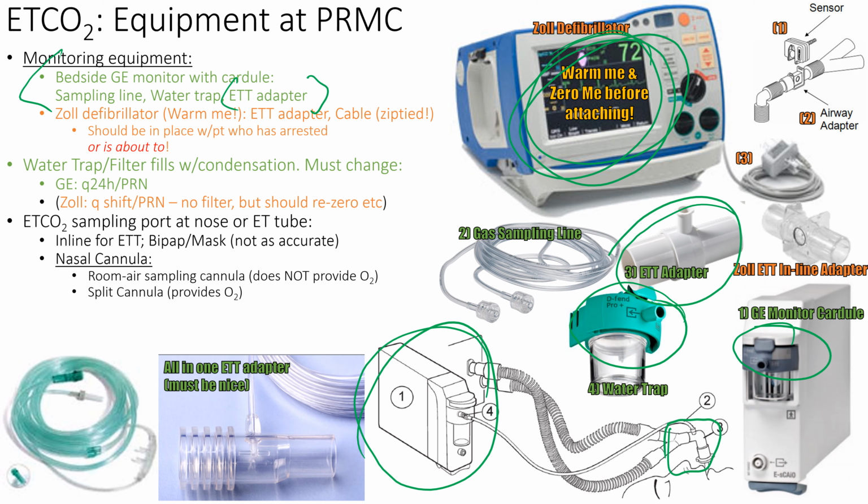So you can pop open the packages. Right, you can try that. You can pop the package open and try to take the little gray cap off. Right, you can see how it works.